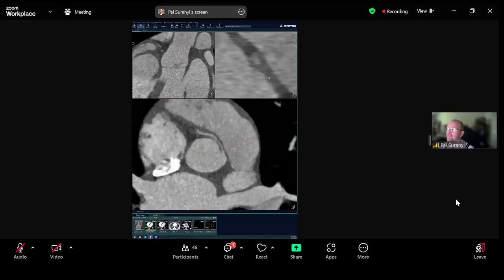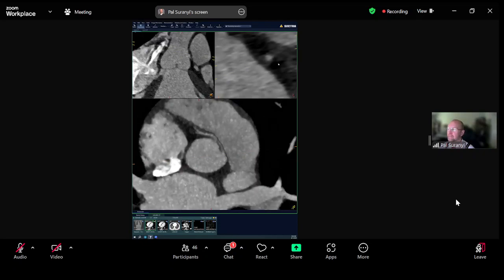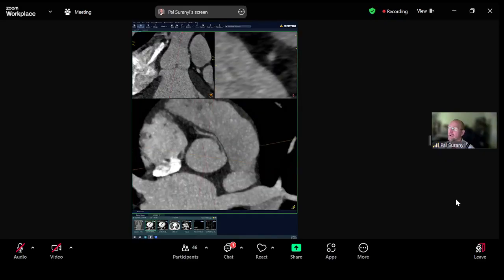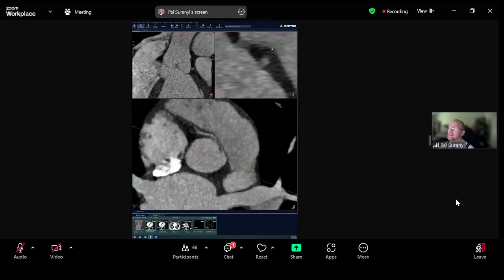And it runs in the wall of the aorta, and then it comes out, and lo and behold, now we are in the epicardial fat. But you can see the difference of the right coronary artery. Even the caliber of this coronary is significantly reduced proximally. It's about 2 millimeters here. And then if you go back to its origin, it gets really narrow here, especially in this dimension. It's narrower than in this dimension.